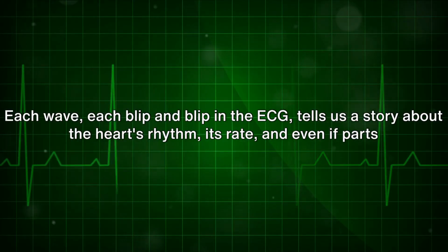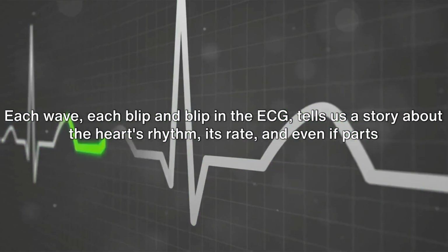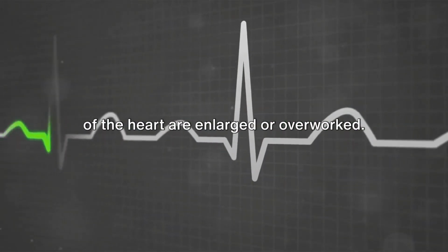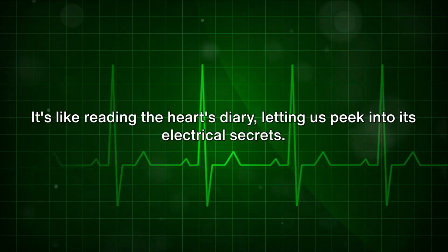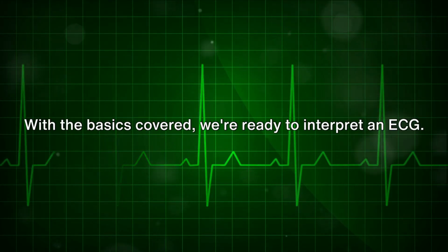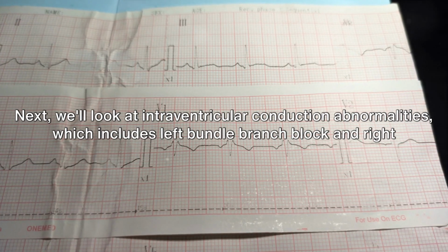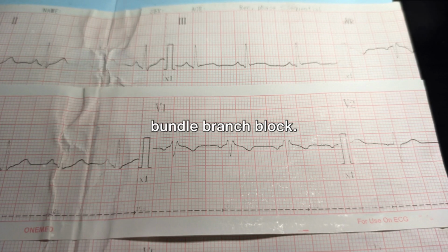Each wave, each blip in the ECG, tells us a story about the heart's rhythm, its rate, and even if parts of the heart are enlarged or overworked. It's like reading the heart's diary, letting us peek into its electrical secrets. With the basics covered, we're ready to interpret an ECG. Next, we'll look at intraventricular conduction abnormalities, which includes left bundle branch block and right bundle branch block.